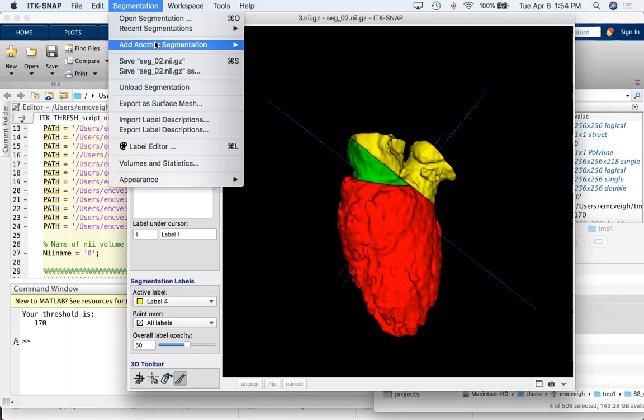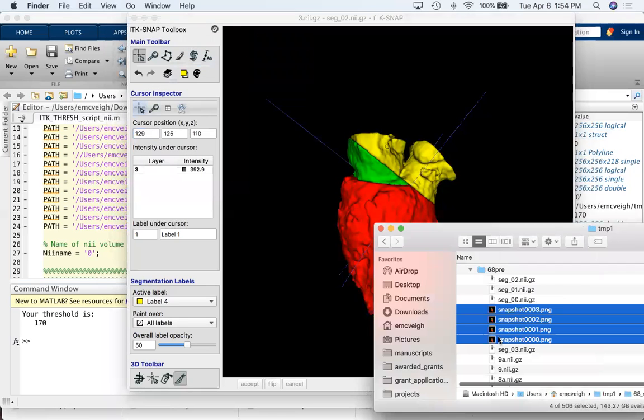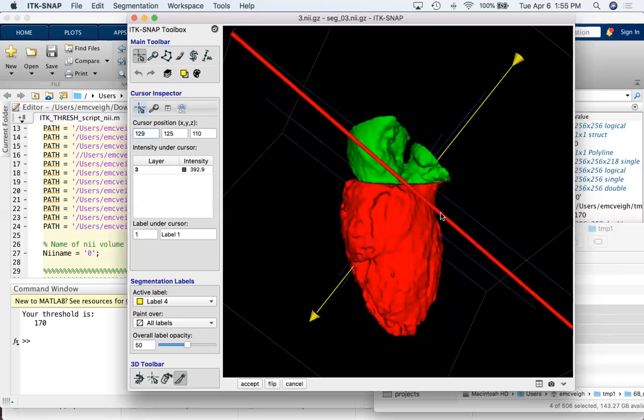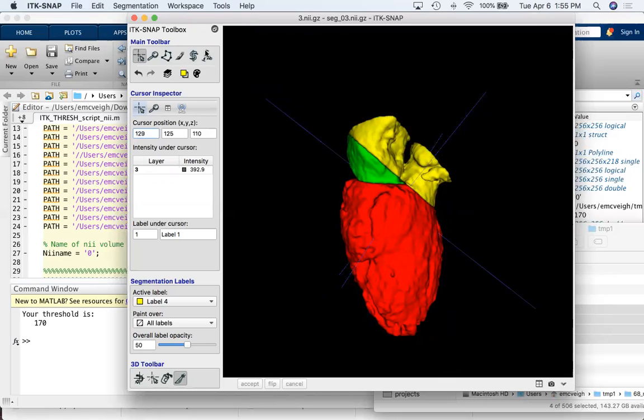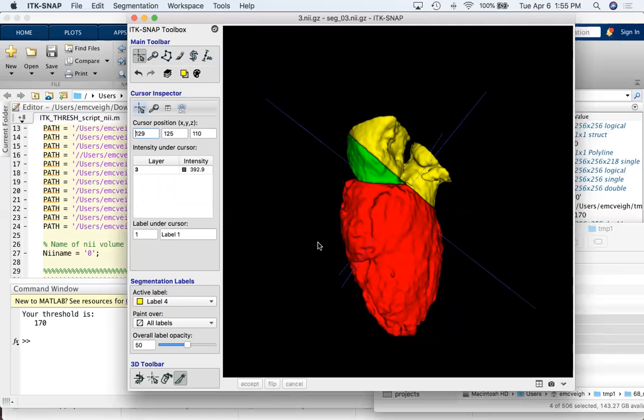I'll just say that. And then drag 3 in. In my case, the truth is a little bit higher, but I guess I should go higher. But the trick, as I'm seeing you doing it, is that you don't move anything. You just set exactly the good point of view, and then you just do it over and over again, and basically they will be parallel planes because you haven't changed the orientation of the heart, and they'll be very regular.